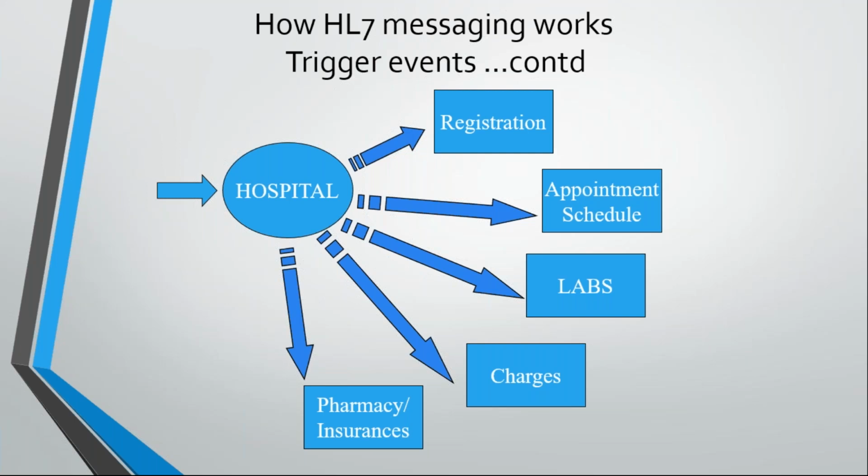The way we build the transformations in Ensemble is different from Mirth Connect. And if you talk about any other interface engine, it will be different. But the logic remains same. The mapping concept of mapping the data that you're extracting and mapping it with the HL7 fields and components remains same. But all that you need to know is how that application has to be used to perform this particular action.